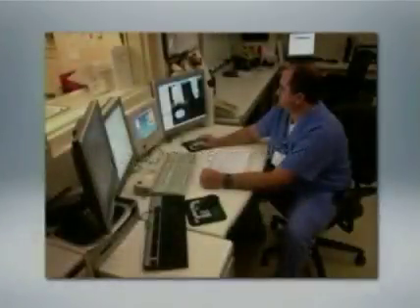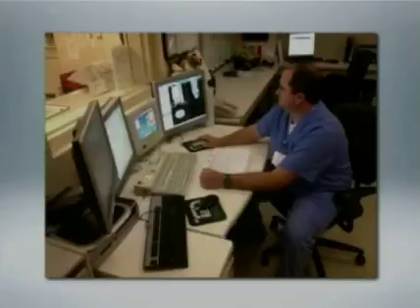And again, here's the CT parallel. This is a picture of one of our CT technologists working at the CT console. Typically, we do multiplanar reformatting on all our scans, usually at least coronal, sometimes coronal and sagittal. And those are done automatically by the scanner. We do them all the time, so it's part of our workflow.